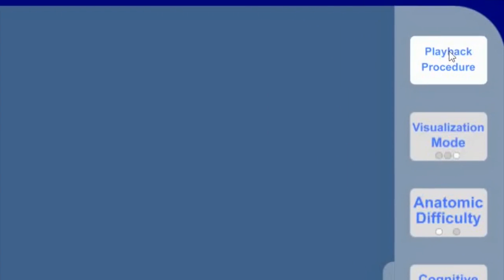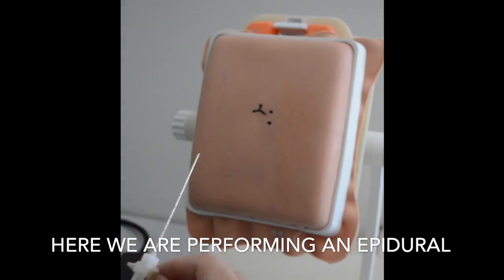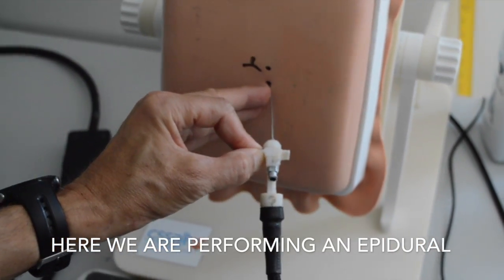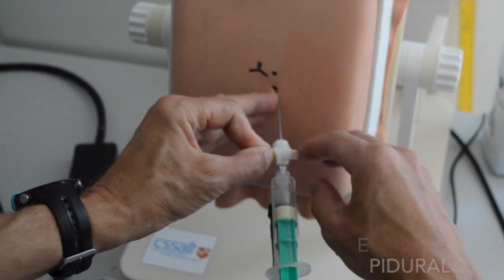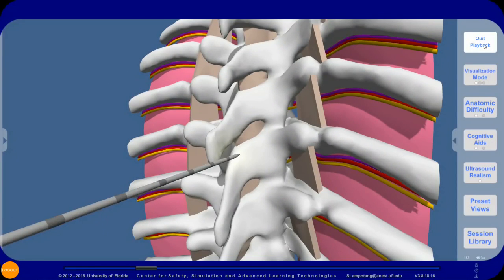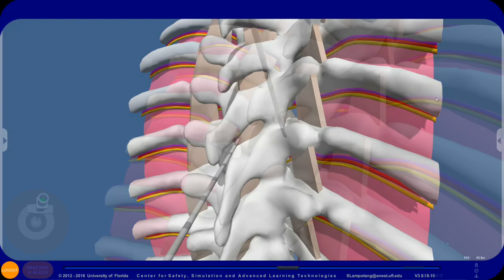If you wanted to record a procedure, you will first click the Record My Procedure button. Then you will perform the procedure. After you have performed the procedure, you will take the needle out and press the playback button. After pressing the playback button, you will be able to see the procedure you just performed.